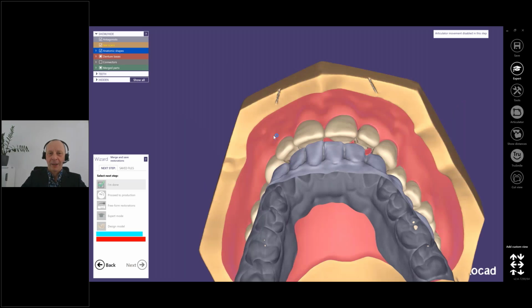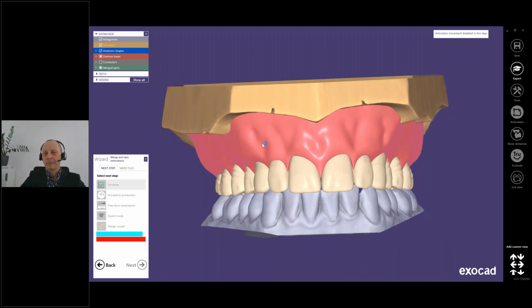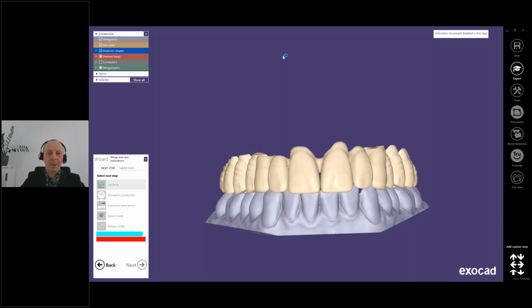The calculation again takes some time. Okay. During the calculation, there was one question. Will you demonstrate the basal trim of teeth method? I'm not sure if I'm getting it, but the teeth will be trimmed to the model. Maybe you can hide the base, Mikhail. Yes, yes.